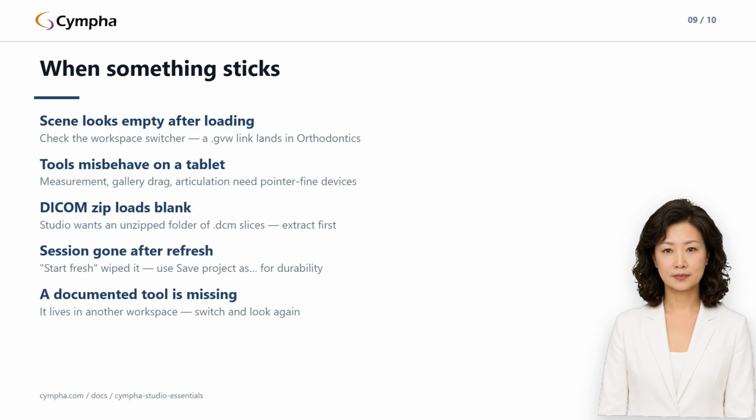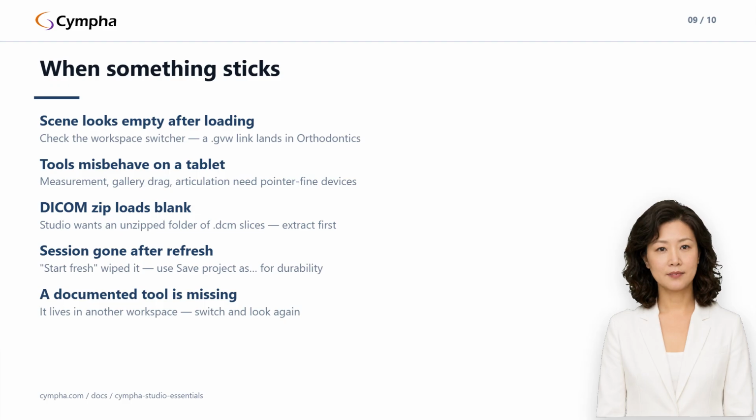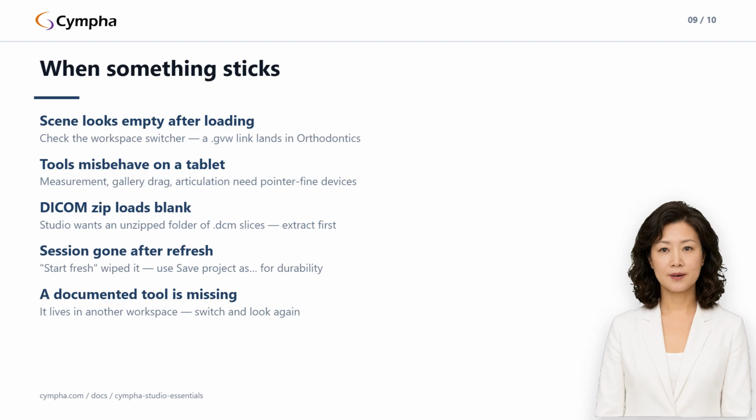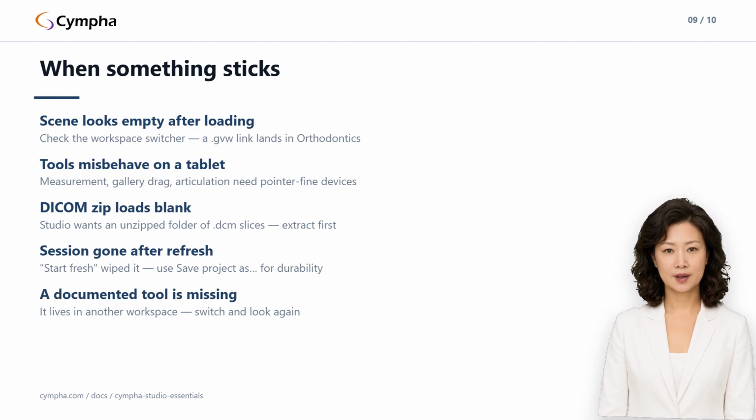A DICOM zip loads blank. Studio expects an unzipped folder of DCM slices, not a zip, the opposite of app.Cympha.com, which accepts zipped DICOM for upload. Extract, then use Open DICOM on the folder. Your session is gone after a refresh. Studio offers a restore previous session prompt on the next load, but if you clicked Start Fresh, that session is wiped. Durable keeping is what Save Project is for.